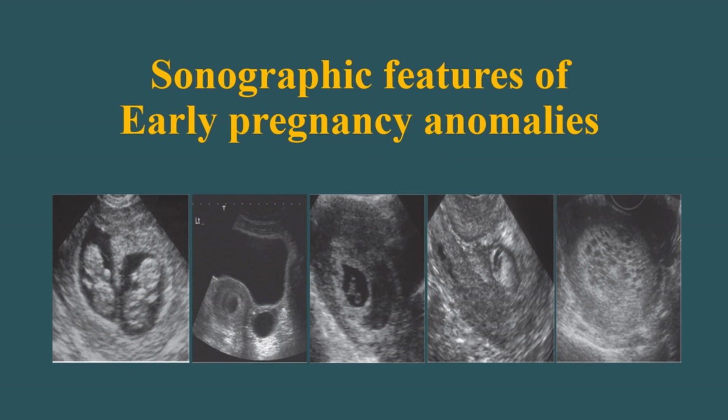Hello everyone, welcome to radiology cases tutorial. Today we are going to discuss the sonographic features of early pregnancy anomalies.